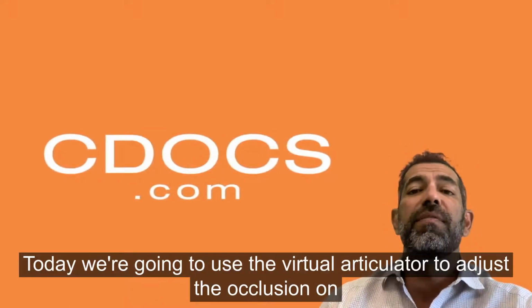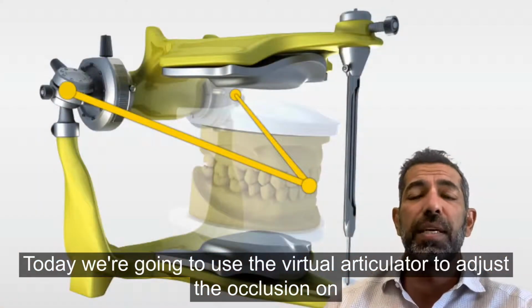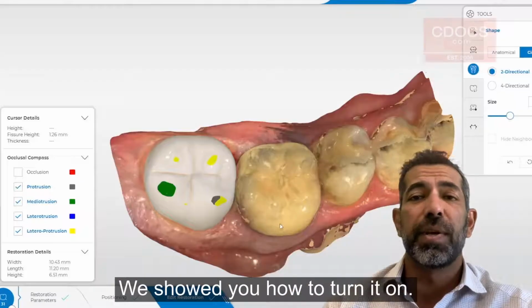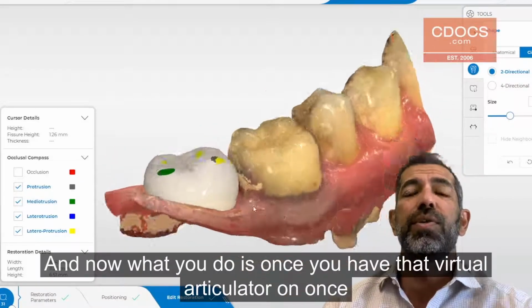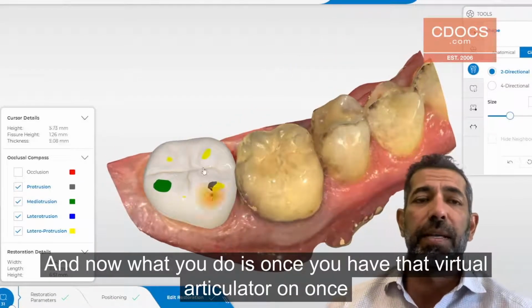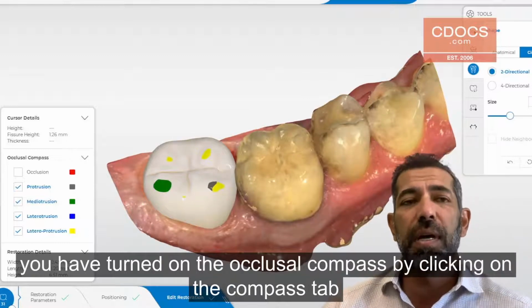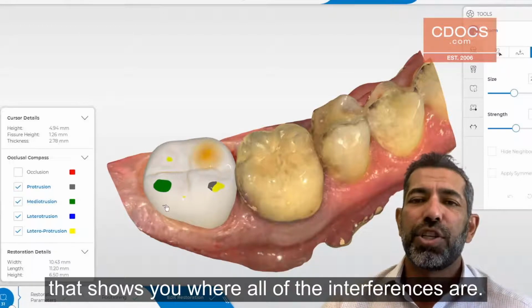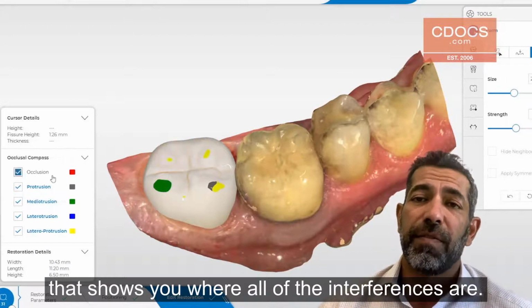Today we're going to use the Virtual Articulator to adjust the occlusion on our CEREC restorations. In the previous video we showed you how to turn it on. Once you have that Virtual Articulator on, and you have turned on the occlusal compass by clicking on the compass tab, that shows you where all of the interferences are.